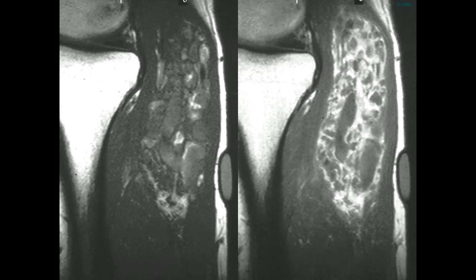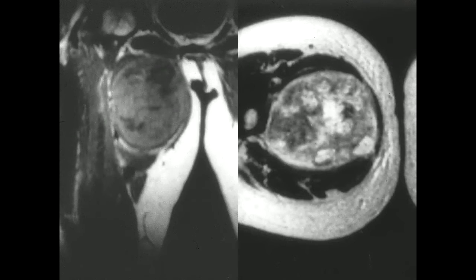hemangioma with thrombosis. We'll talk a little bit about the distinction between benign and malignant, and here we can see this large mass within the thigh. It's big, it's deep, it's heterogeneous, certainly all the worrisome features of malignancy, but I show this case because the mass in and of itself is relatively nonspecific.